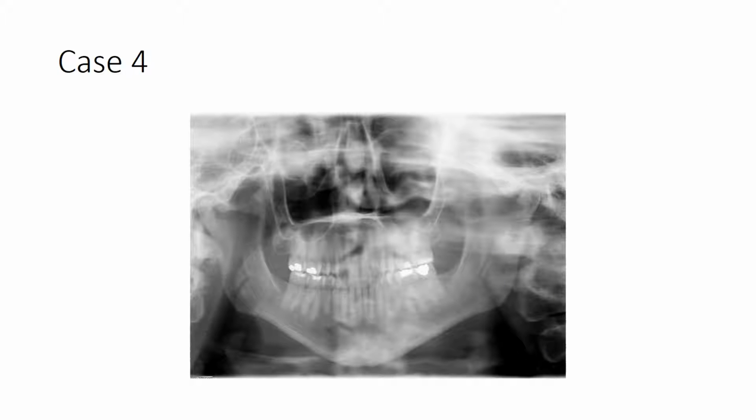Case 4, this patient fell and hit her upper front teeth, and this is tough. I mean, this was obviously not the greatest radiograph, a lot of stuff going on. The one thing you should look at in cases of trauma is look at the occlusal plane, and then look at these maxillary teeth, how far down they go. I mean, it is true that the maxillary teeth overlap the mandibular teeth, but that seems a little bit excessive.